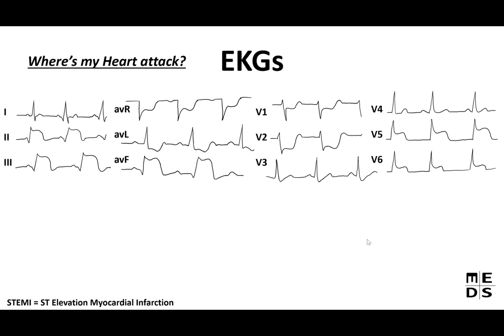So I'll give you a second to look through this and see if you can pick it out. All right, so real quick, here are the arrows where the actual ST elevations are.